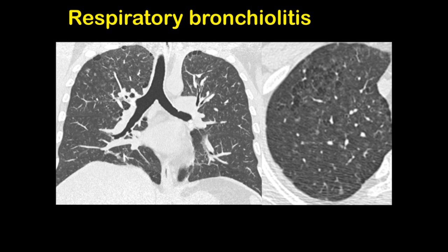Another patient where you can perfectly see the small centrilobular ground glass nodules with an upper lobe predominance in a patient also with paraseptal emphysema and smoker. We can also see areas of centrilobular emphysema in a patient with respiratory bronchiolitis.